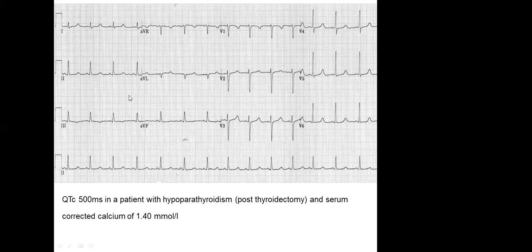So in this patient, when we calculate QT interval, we have to see that QT prolongation is calculated in lead 2. As a dictum, QT should not be more than half of the RR interval, and there are very good calculators like the MD calculator app, which is a very good way of checking the QT interval.